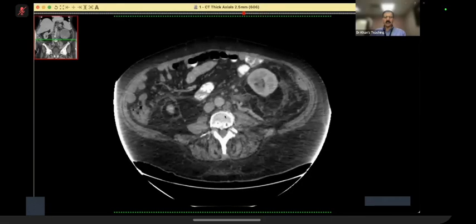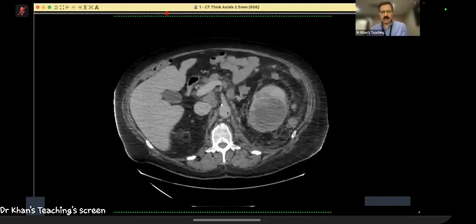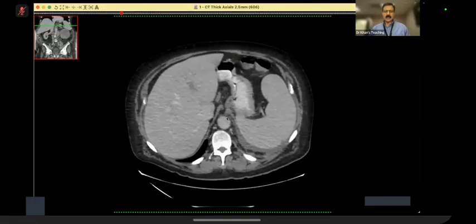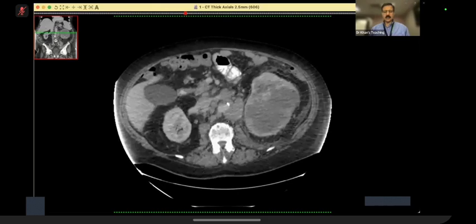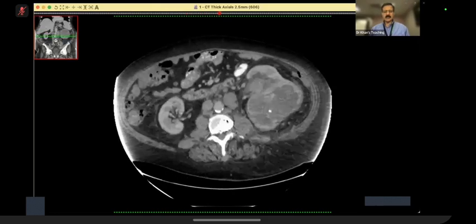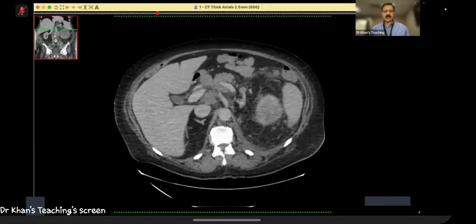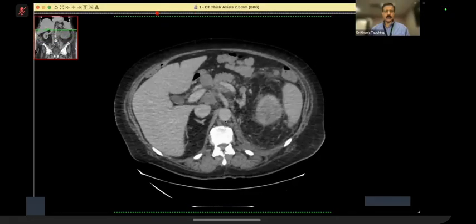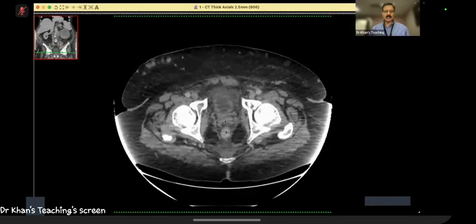This particular case I am showing you is a classical case, actually not for a VIVA, but for a long case. There are many types of cases which come in long cases, and one type is where the case is simple, but the findings are multiple. Everybody is going to pick up that this is an RCC, and most of you are going to pick up that this RCC has got bony metastasis.